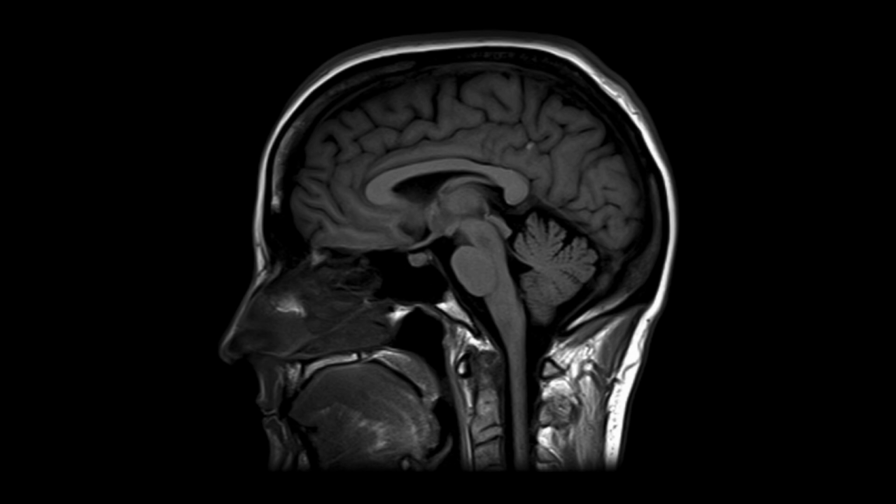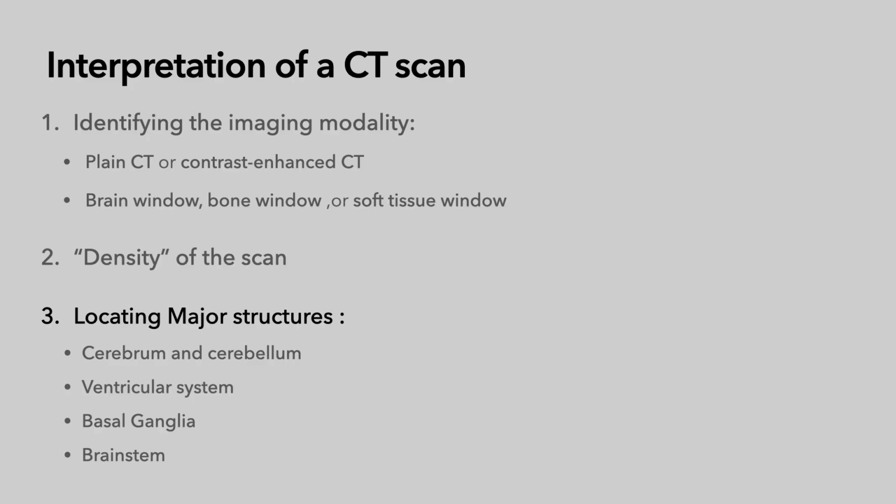And one more time, MRI. We're not discussing MRIs, but MRIs show way more detail than CT. You can see here the midbrain. This is a sagittal MRI, a cut through the sagittal suture. Here is the midbrain on top, here's the pons in the middle and the medulla on the bottom. And now we're going to highlight it. Midbrain, pons, medulla.